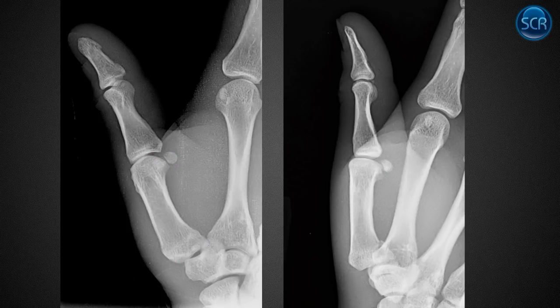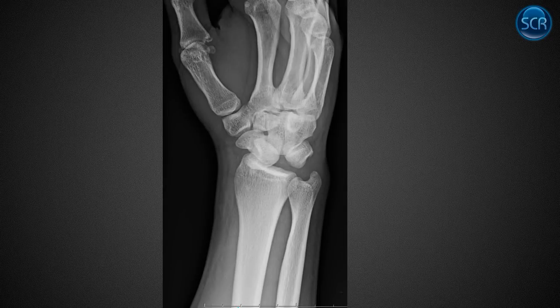But we look at the base of the thumb here, and it doesn't look that smooth. It's a little irregular. And now we see on this one, we actually do have a focal area of cortical offset. So this is a Bennett fracture. They fractured the base of their thumb. And so you want to make sure you're looking carefully at that. It's very frequent to have big old degenerative osteophytes here in older age. But this is actually a very common site of fracture as well. So that's a Bennett fracture.